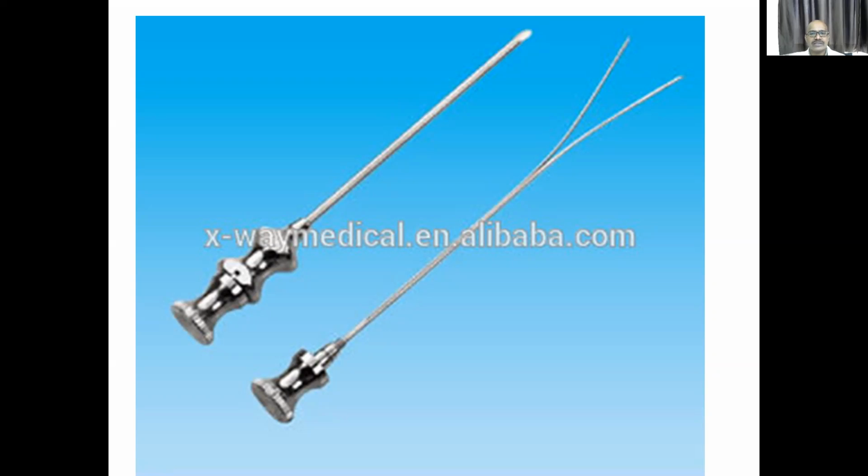So we have three needles. One is the bone marrow aspiration needle, a stout needle with a guard. In case of bone marrow aspiration needle, you will have a guard over there. That is the main difference. The liver biopsy needle also appears like the bone marrow aspiration needle, but the needle is bifid and long. That is a liver biopsy needle. The very thin, very delicate needle is a lumbar puncture needle.